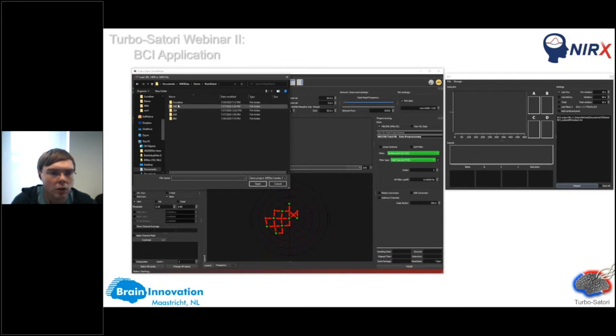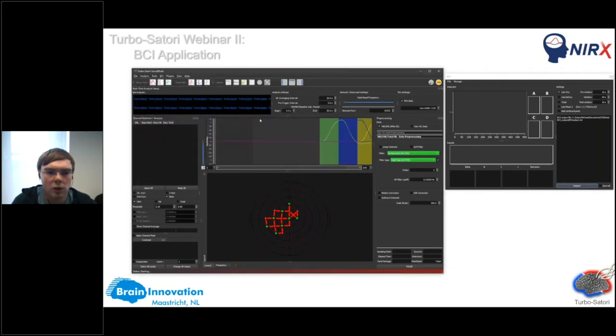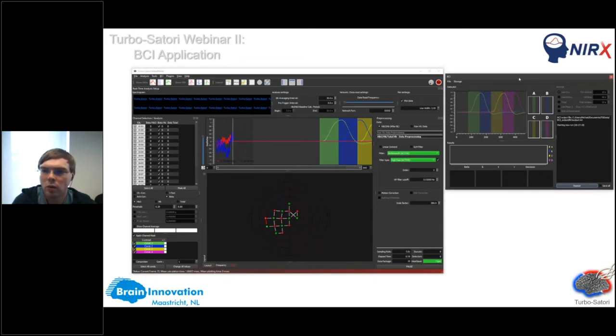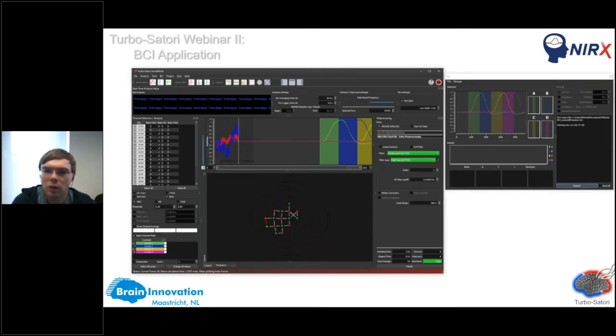Now I decoded the choices, so we don't know which choice this specifically is. And just by selecting the channel that we know should have a good signal, we can provide input to the dialog over here. Now we increase the read-in speed a bit because it would take more time, and you just use this wheel here at the top.